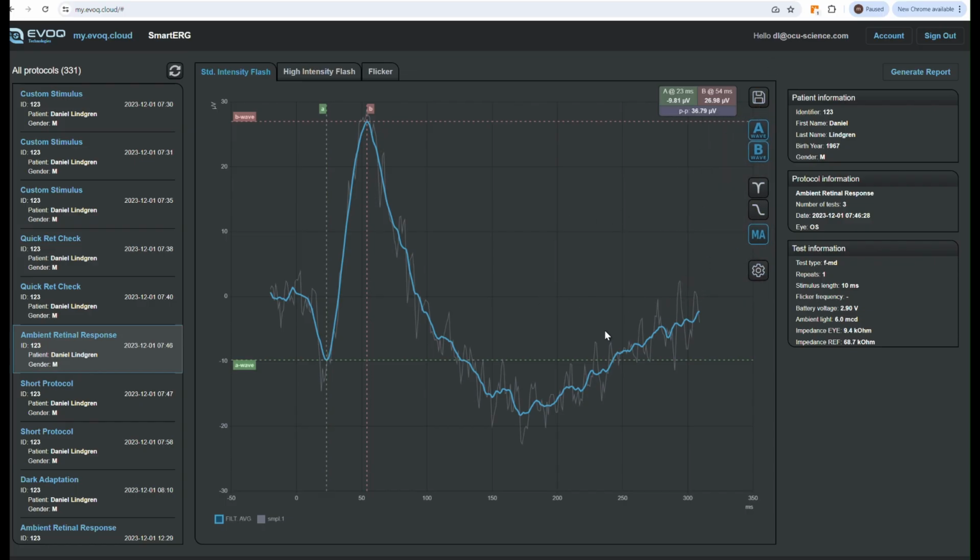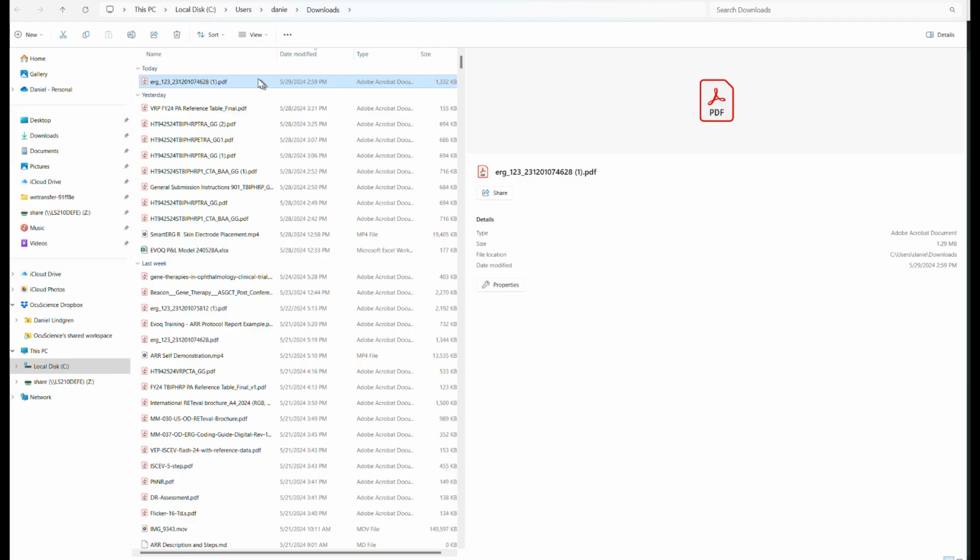Now this information is updated. From all this we can generate our reports, which will create a PDF, which I will open up here real quickly and view for you.